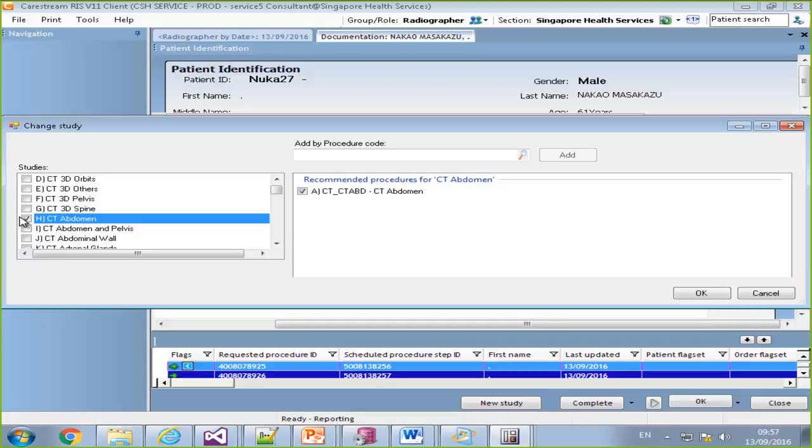You just had to take that into account depending on how data windows were designed. We just didn't know how the sites were going to set these up. But if all your CTs belong to the same group, the field's not going to hit these types of scenarios. So we just have to present the worst case scenario. So it may seem complex, but it doesn't have to be designed that way in the field. Sorry if I've scared you.